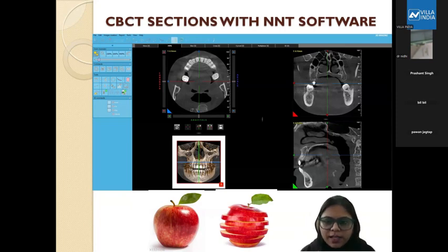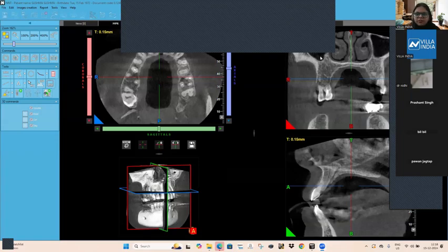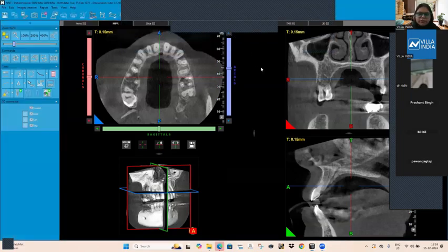One minute. I'll share the slide. Share. Just a second. Give me a second. No issue, ma'am. I'll share the software screen with the people so that they can understand very well. So, can you see the software here? The screen of the software here? Yes, ma'am. Okay.